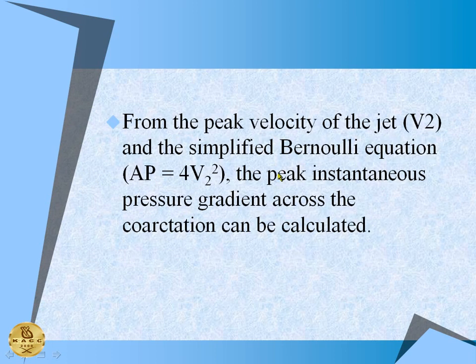From the peak velocity, as an echocardiographer, whether a cardiologist or a technician, you can calculate the pressure gradient, and it's important information in the echo, because we can say by 2D it looks tight, by color it looks turbulent. At the end of the day, we want a difference in pressure to tell us the severity. The equation is very simple. It's the simplified Bernoulli equation. You multiply 4 by the velocity you got by the continuous Doppler, which was squared, then you get your result.